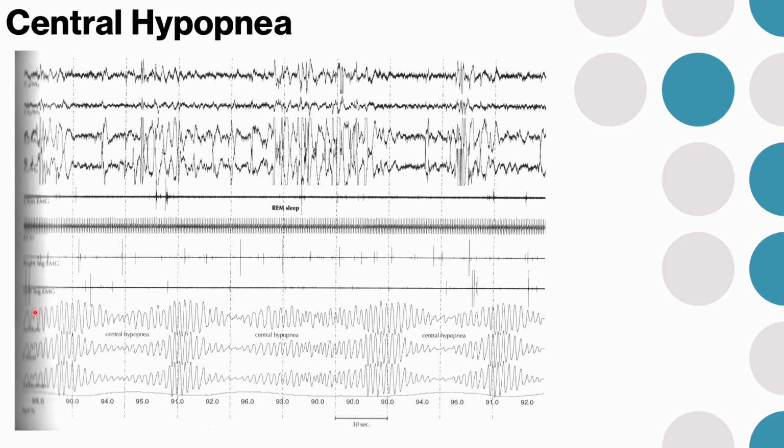This pattern, and you're going to hear it and see these words on the test, exactly the words, is waxing and waning, or crescendo-decrescendo. Crescendo means to get louder or bigger, and decrescendo means to get smaller or quieter. That's a musical term. Waning is going down, waxing is getting bigger. There are a few reasons for these kinds of respirations. One of them is heart failure, because the heart can't pump that blood anymore. So this is a way that it gets away with not doing it so much. But this is what you get.